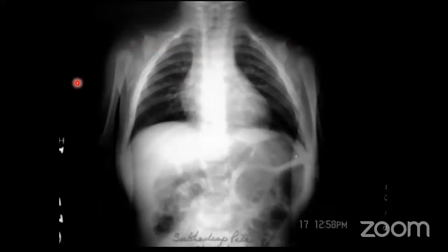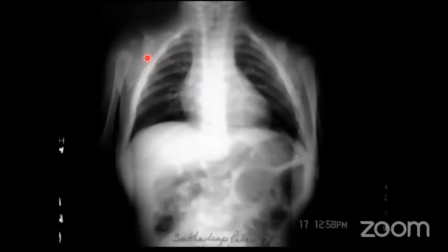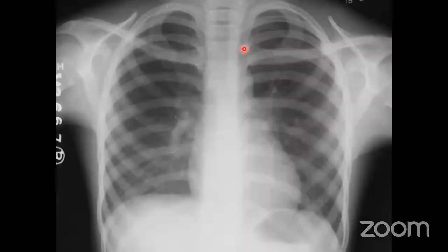In the previous case the clavicle was rudimentary, visible but rudimentary. Here it is totally absent. So this is a child of cleidocranial dysostosis. Whenever there is total absence, it is cleidocranial dysostosis; if there is some rudimentary clavicle, it is progeria. Obviously, you should see the face and other things also. What is this? Your time starts now.